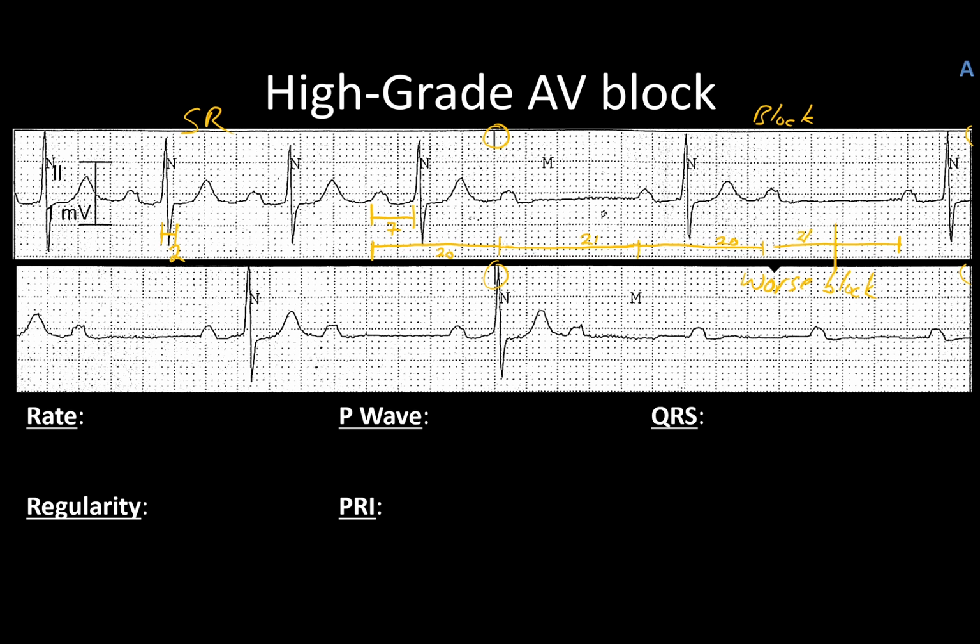So you can already see the regularity on those P waves. And we'll measure again down here below. This is one continuous strip from one to the next. So to be able to compare these so close side by side really does help show off exactly what's going on. And we'll start from here to here. And both of these are 19. So we have that and that.